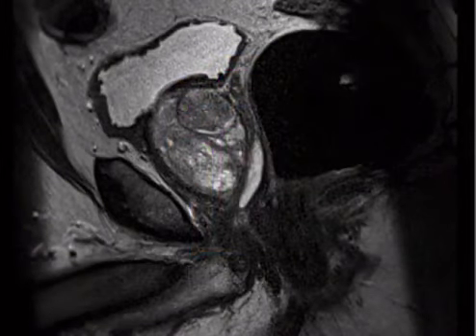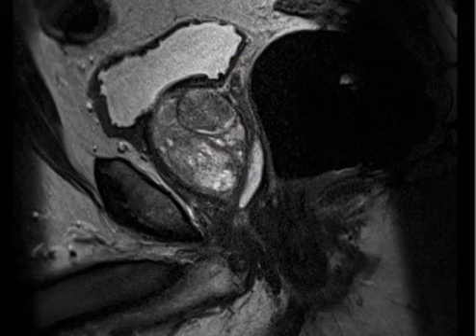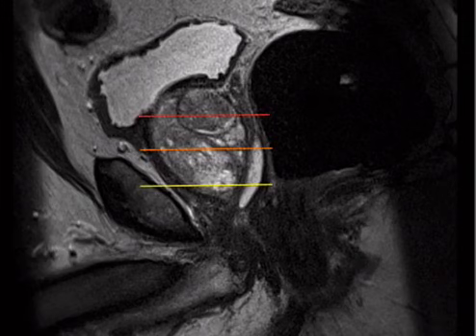So a lot of programs don't do prostate MRI. Probably a lot of community programs don't do it. And I'd be willing to wager that probably 30% of the people watching this lecture have not seen a prostate MR before, which puts you at a significant disadvantage. So fear not, I'm going to try and cover everything that you need to know about it. It's not that hard. Let's start off with some anatomy.